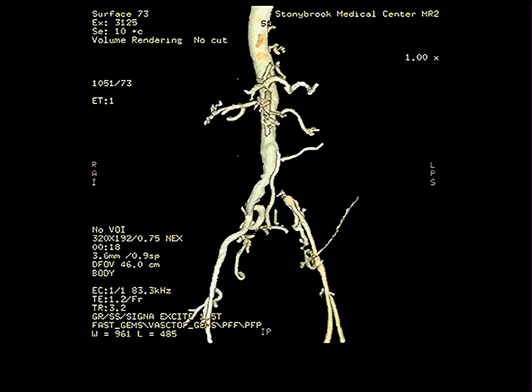Occluded left common iliac. Yeah, left common iliac. The left common iliac is completely occluded in this person, completely occluded. And this is all being filled by all the rest of it. I mean, here's the external iliac right here on the left side. Here's the internal iliac on the left side. That's all being filled by anastomotic flow from the other side, to be honest with you.